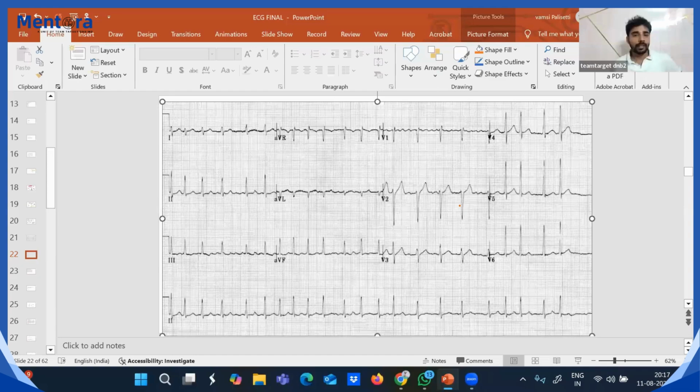But multifocal atrial tachycardia, to say it is a multifocal atrial tachycardia, you should have 3 different morphologies of P waves. I am about to go through the definition, right? To say it is multifocal, you have to see 3 different morphologies of P waves in the ECG, then only you can say it is a multifocal atrial tachycardia, right? So this usually will go for the AF. It's a narrow complex, it's irregular, there are no P waves, you can label it as atrial fibrillation.